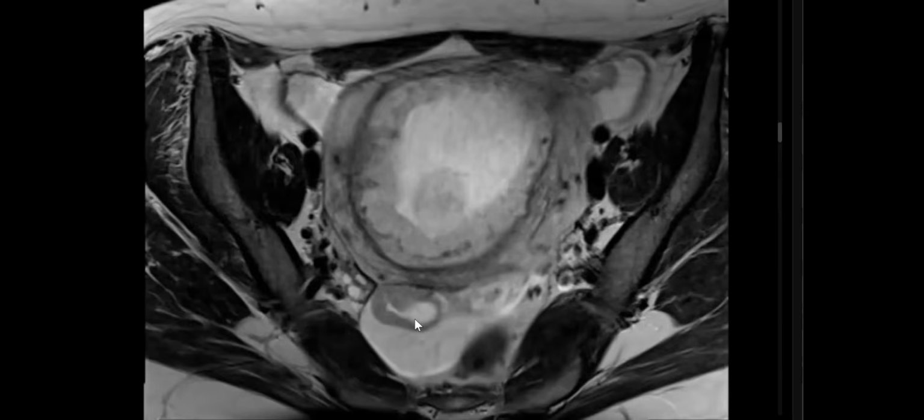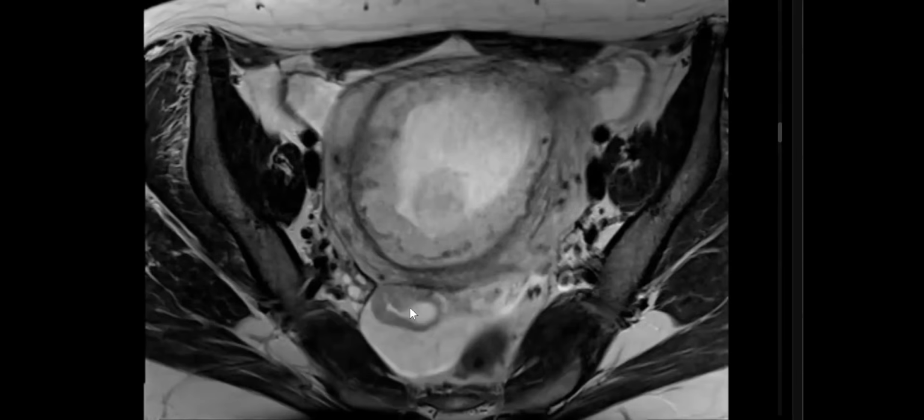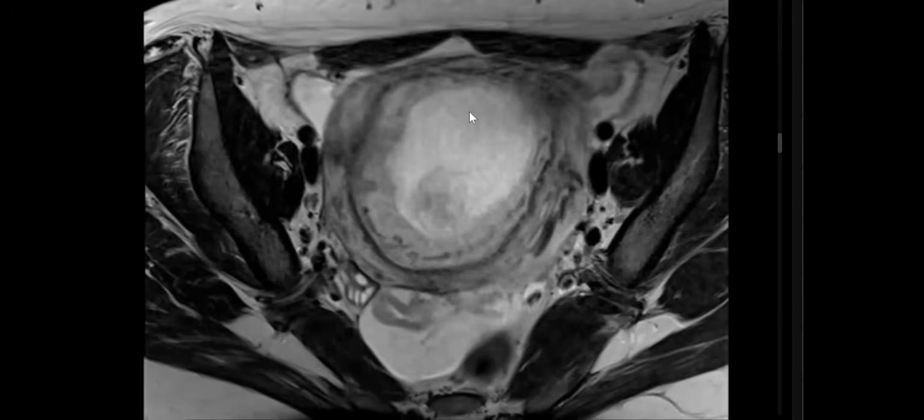No problem. It's corpus luteum of pregnancy. Corpus luteum, in case of a pregnant lady, continues to grow till 3 months. So this is early or first trimester. So this case is ovarian torsion in pregnancy. Okay, so MRI for acute abdomen in pregnant ladies is very, very important.